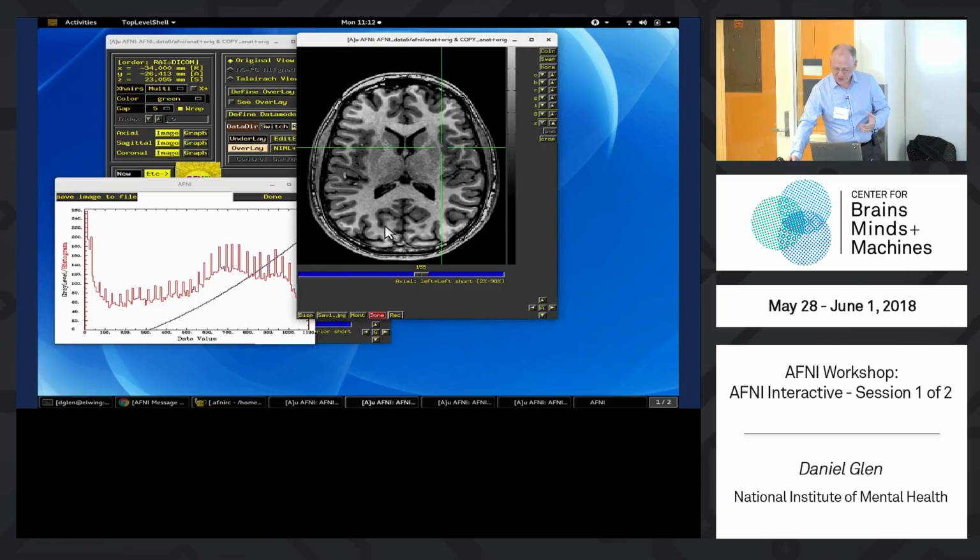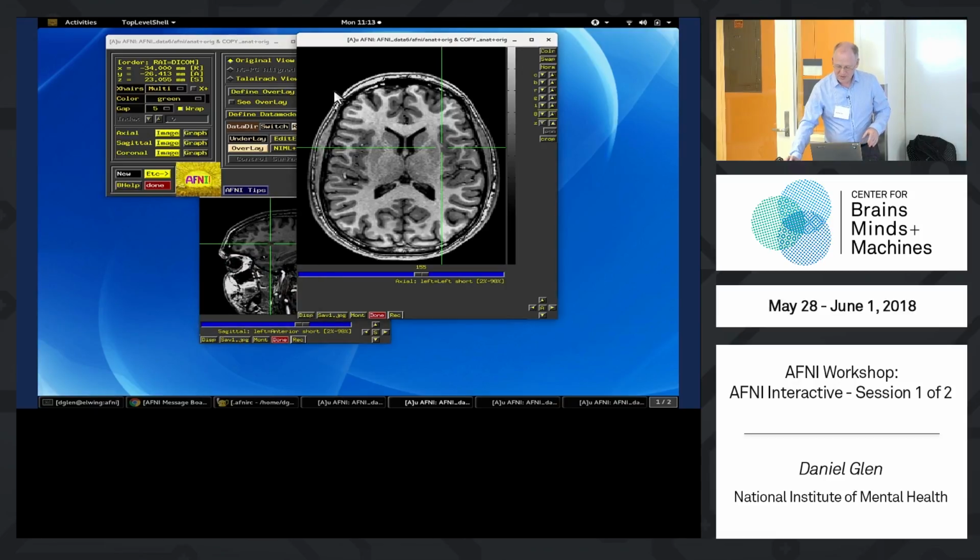Anyway, I wanted to show you this is what brightness does. See that black line is just raising and lowering that. And contrast is just changing the tilt to that. And you can play with gamma and see how that changes the curvature of that. All right, I'm going to click done on that.